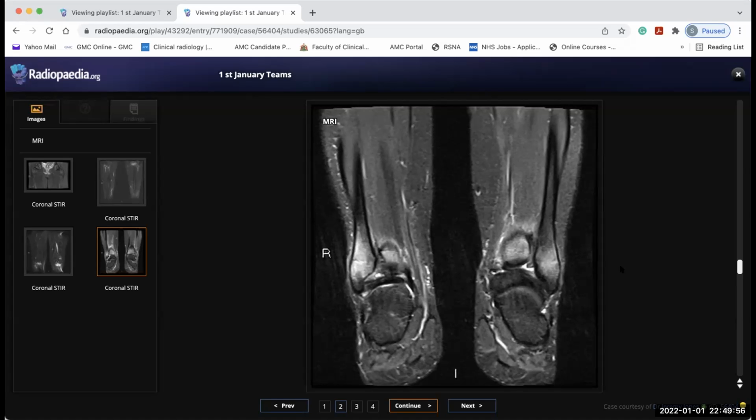Like any stress fracture can happen, but this is unlikely with this presentation. Why unlikely? The presentation or the appearance in the MRI? The appearance. Can infection happen with the same appearance? There is chronic recurrent osteomyelitis in kids, but this is not the appearance. Basically, it will not be so symmetrical and involve so many joints.